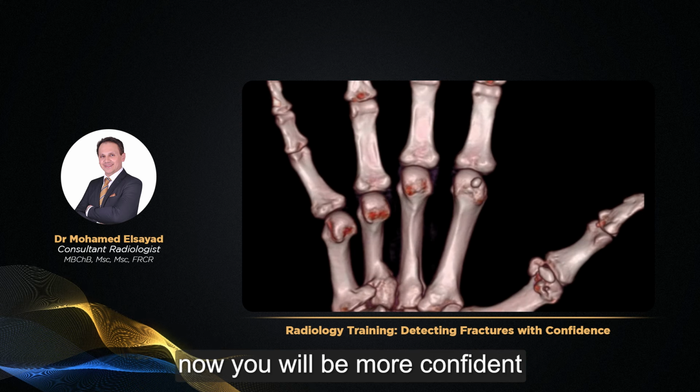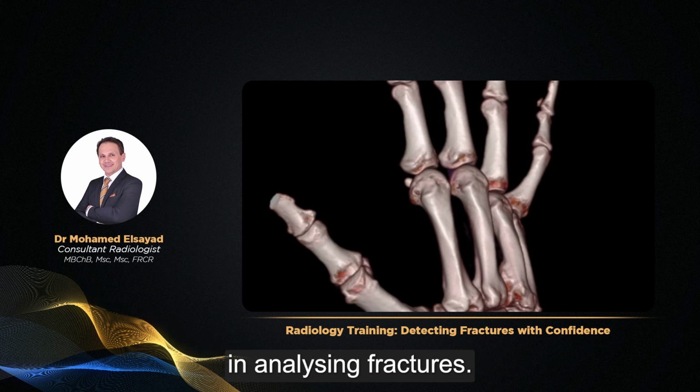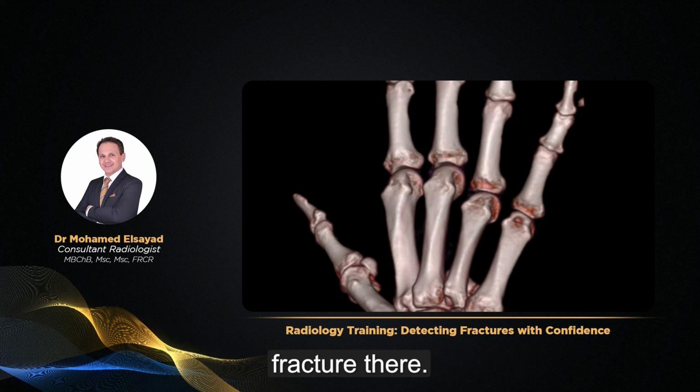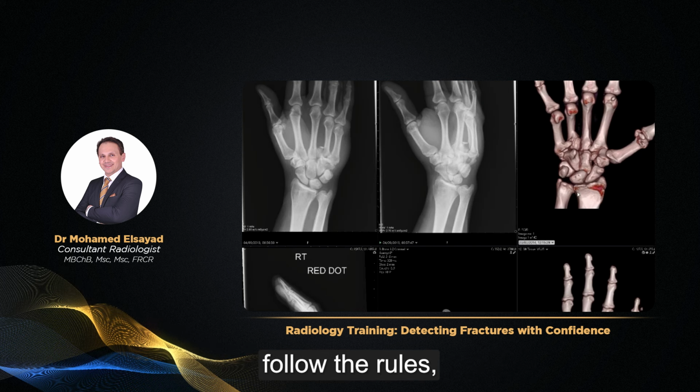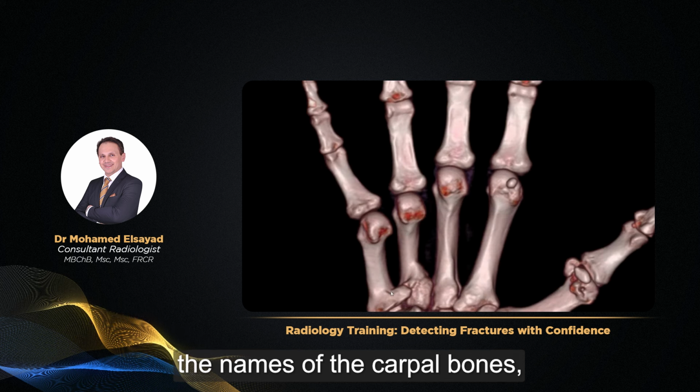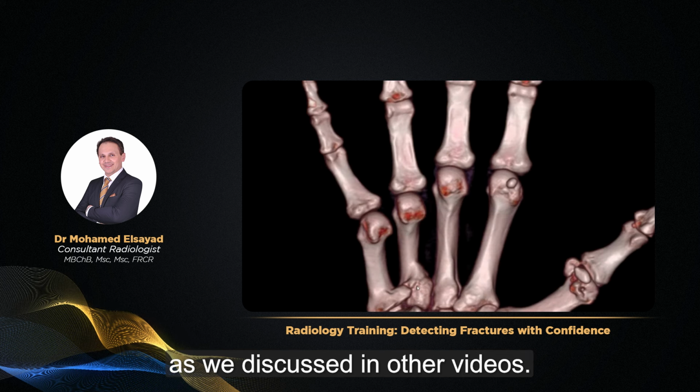I'm confident that you will now be more confident in analyzing fractures, and don't get intimidated when you see such a complex fracture. You just need to follow the lines, follow the rules, understand your anatomy, and make sure you know the names of the carpal bones as we discussed in other videos.